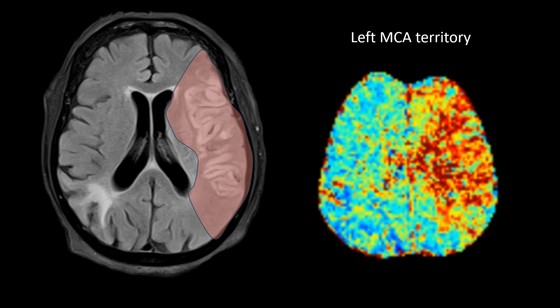This also tells you the importance of MR perfusion images. You should be aware that if there is a small region of infarct on diffusion and a large perfusion defect, which means there is a large diffusion perfusion mismatch, that means there is a large area which is prone to undergo infarct, and which is why you should be aware of this, because this area can still be saved.